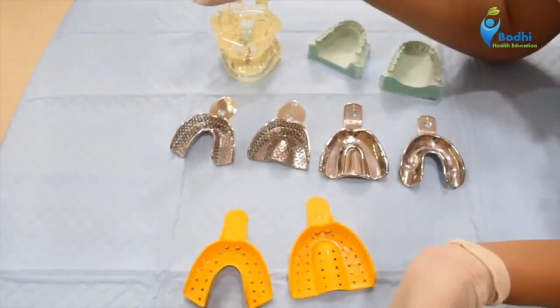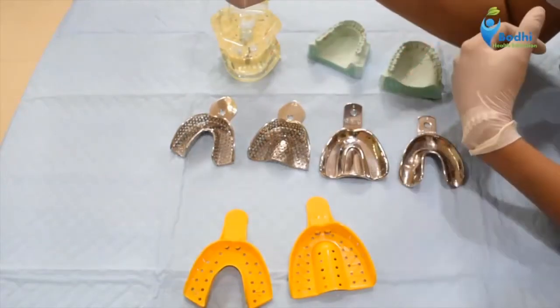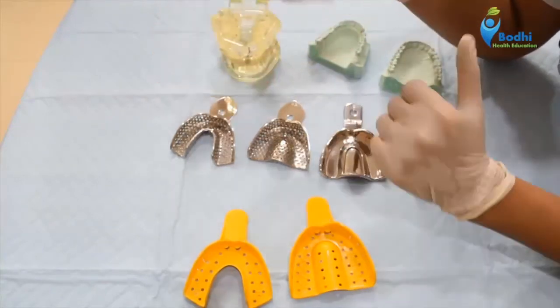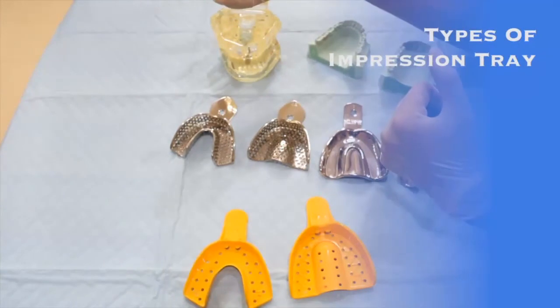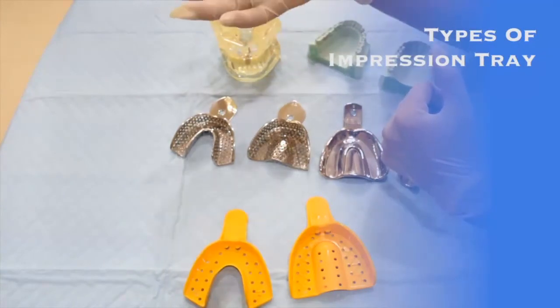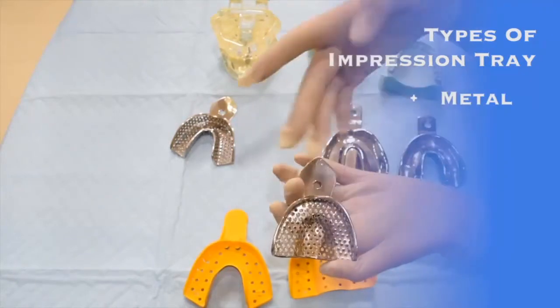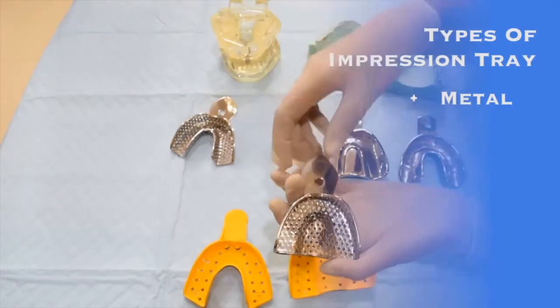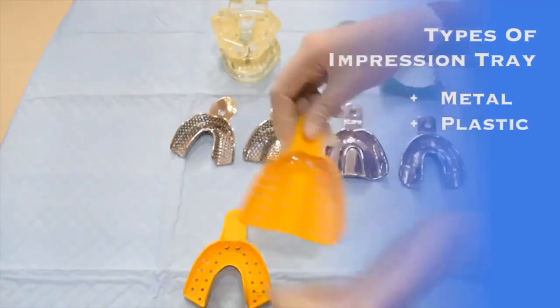So now that you know about the parts of an impression tray and what is a maxillary impression tray and what is a mandibular impression tray, let me classify the impression trays. There can be various classifications. One is according to the material. So impression trays can be either metallic, and the metallic impression trays can be made out of stainless steel or aluminium, or plastic impression trays.